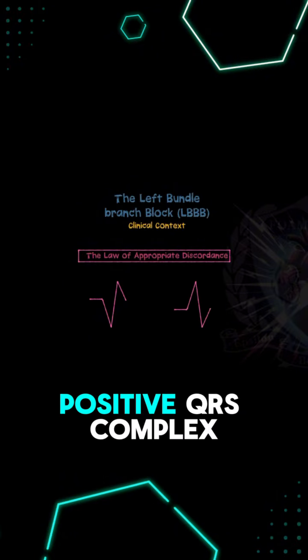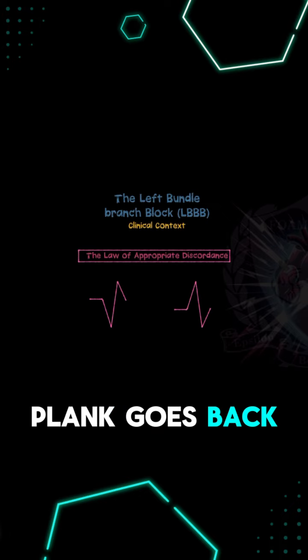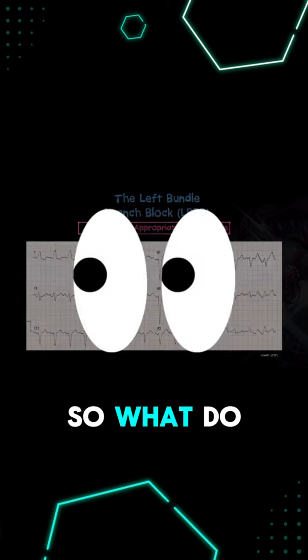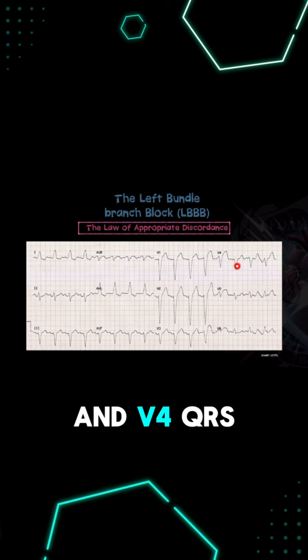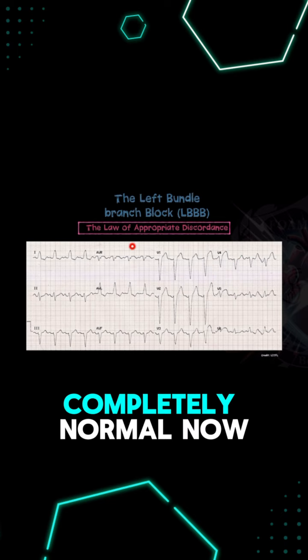If there's a positive QRS complex, there should be some ST segment depression or the J point goes back to the isoelectric baseline. This is all part of a normal left bundle branch block. So what do we see here? We see negative QRS complex, some degree of ST segment elevation, totally normal, right? In V4, QRS is negative, goes right back to the isoelectric baseline, completely normal.